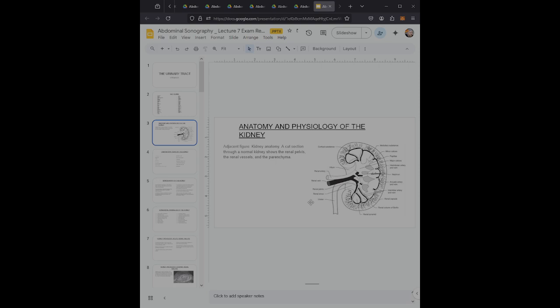The left kidney is also on average a little longer than the right, although typically we are looking for no more than a 2 centimeter difference between kidney lengths. However, suspicion of functional renal abnormalities may abound if there's a difference in excess of 2 centimeters between the two kidney lengths.